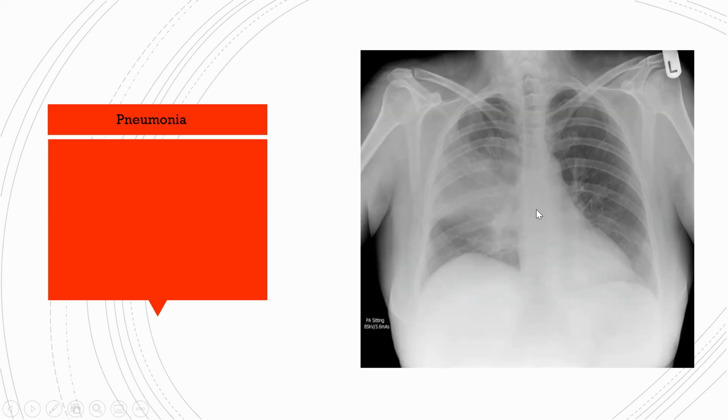What's really important is that we can see some things here, but we're not quite sure what they are. So whenever you diagnose someone with pneumonia and it's a bit suspicious and they're old, make sure that when they don't have the pneumonia anymore, like in 3 weeks, you do a chest x-ray again, because there might be a tumor hiding underneath the pneumonia, which you can't see because it's completely grayed out. So you could see maybe this nodule is a lymph node because of the pneumonia, or actually, is it a tumor around here?